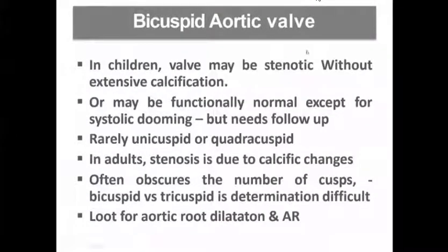So in children, the valve may be stenotic without extensive calcification, or may be functionally normal except for systolic doming, but needs follow-up.